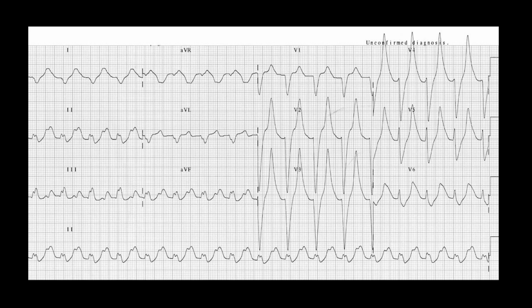This patient, if presenting in any sort of shock state, your emergent therapy would be a bolus of calcium chloride to stabilize the myocardium, because this is a very irritated and unstable myocardium. You would do that emergently to correct this issue before moving on to other hyperkalemic therapeutics like insulin and albuterol.